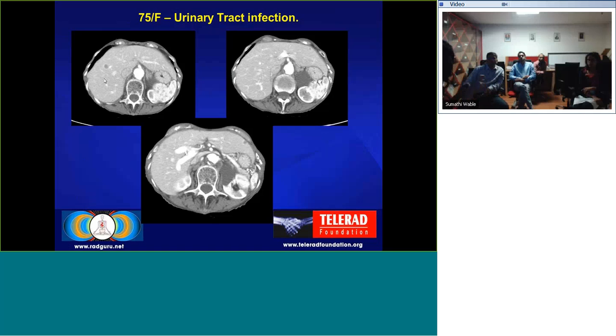They're peripheral nodular. They're not a complete ring. If it is a complete ring, then many of the metastatic lesions, especially the mucinous ones, have a hypodense center and ring enhancing periphery. So I think that's what these are. And there was one cyst, and then there were some of these. And like I said, hopefully we'll get some follow-up. But that is something that you want to keep in mind, especially on CT.